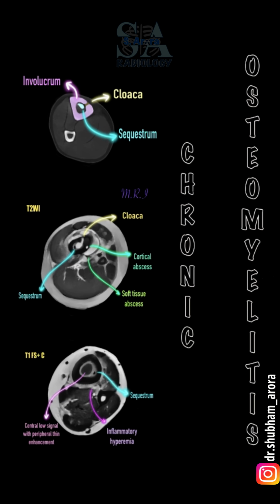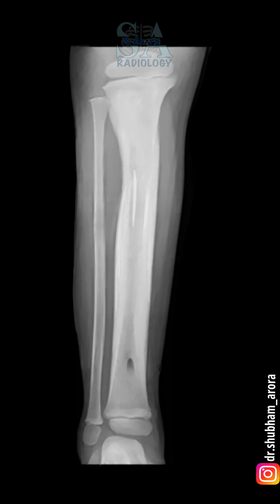Hi, this is Dr. Shubham Arora and today we will be discussing chronic osteomyelitis. Let's start with an X-ray AP view.